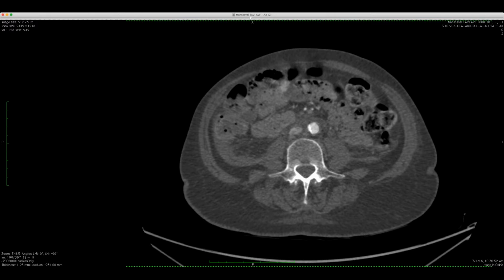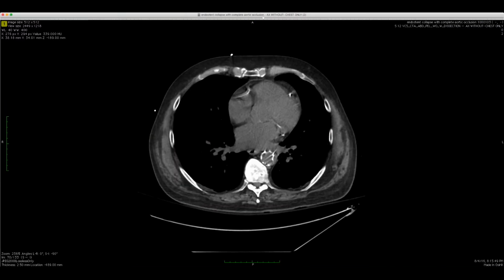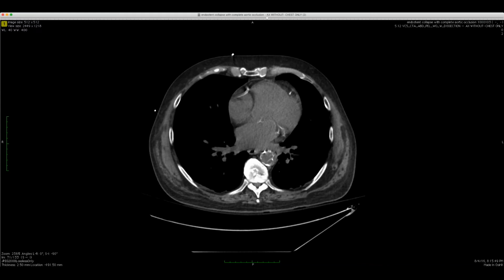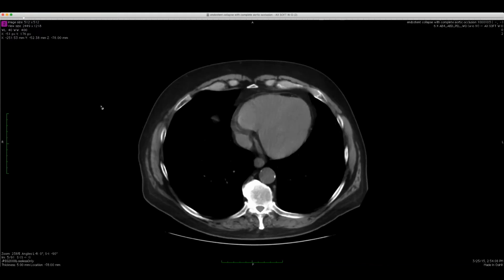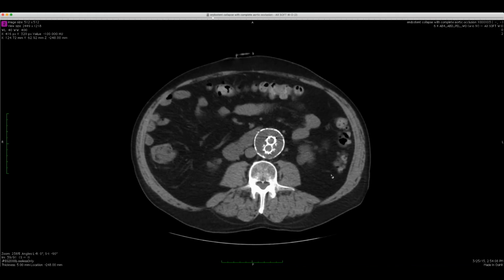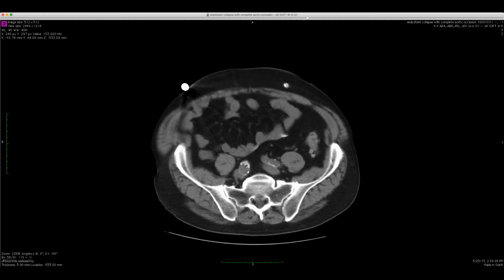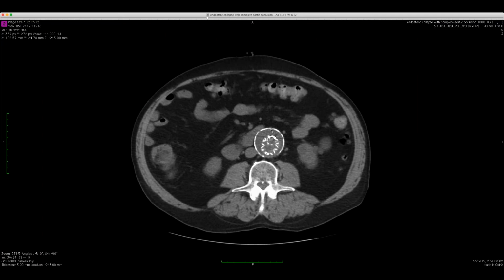This is a patient who came in with severe lower extremity findings, essentially purple, blue lower extremities. And I'll show you a couple of images here. Oh, sorry, let me pull up the screen. Okay, so we have a non-contrast CT here, and I'll actually show you in 2015 first. Here's a non-contrast CT, and we had this endograft, this endostent here, and we had an infrarenal abdominal aortic aneurysm. It's an endostent that we can see, and it looks pretty good here.